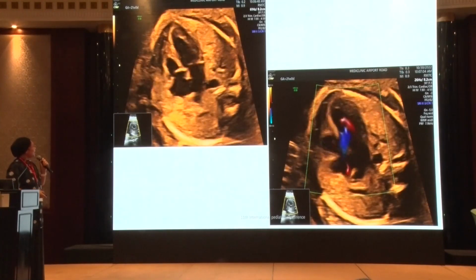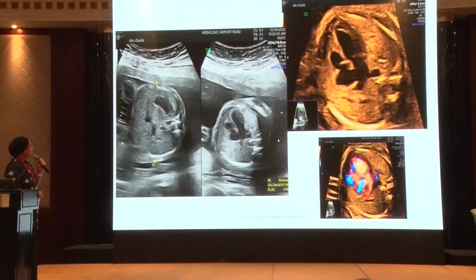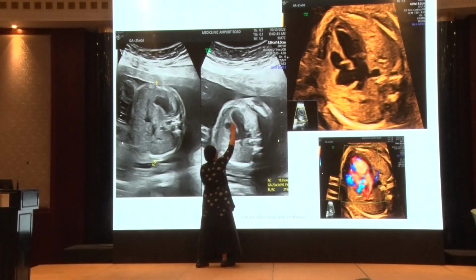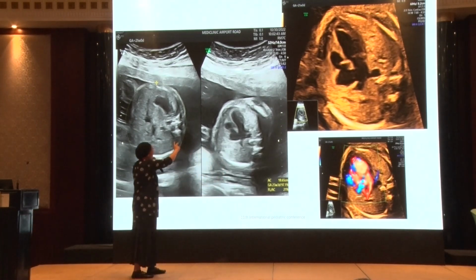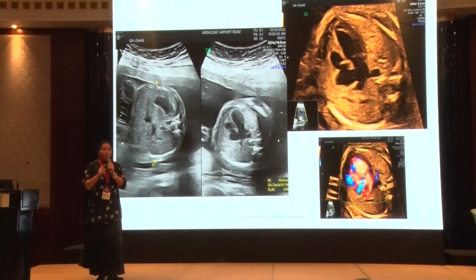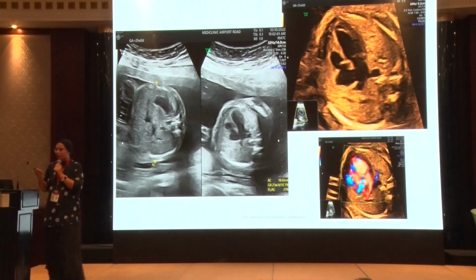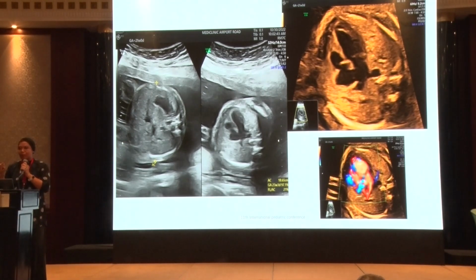Actually, that's exactly correct. Even in the previous image, when I put the first image, I was thinking, why does this right ventricle look like this left ventricle? It looks a little bit weird. That's what will happen with most of the cardiac abnormalities. From the beginning, there will be something that strikes you that this is not the routine section that you are used to. This is the most important. Once you have that thing in your mind that there is something not normal, please continue to look at it again and again until you prove one scenario or the other.